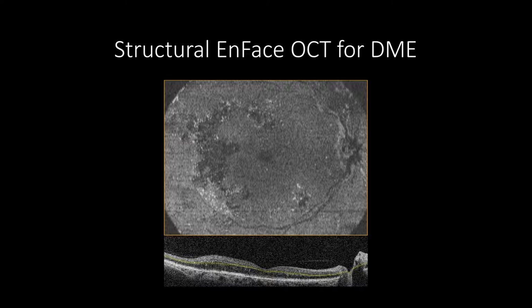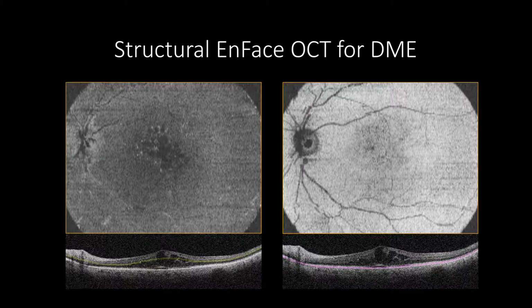The IPL-INL slab gives a pan view of cystic distribution, which appear as hyporeflective cysts, and the hard exudates appear hyperreflective, which can help as a guide for focal grid laser treatment. When diabetic macular edema exhibits intraretinal cystoid changes, the hyporeflective cystic changes may resemble a honeycomb configuration. Other DME cases may appear with only hyporeflective cystic changes, depending on the Henle fiber layer structure.